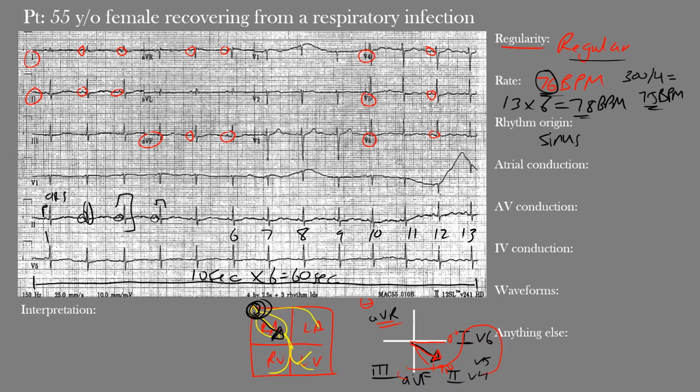And if we look at V1, they're there, but they're more evident in lead 2, okay. So in V1 you can somewhat see them there, but really in lead 2 we can see them. We already kind of highlighted them, all right. And you can see them there.